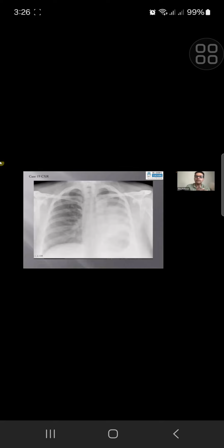So expect in exams that, for example, an X-ray of the shoulder may show a lung abnormality, or an X-ray of the spine may show a lung abnormality, and so on. In your normal practice, you would do a chest X-ray, or a proper X-ray of whatever the abnormality pertains to. Yes.